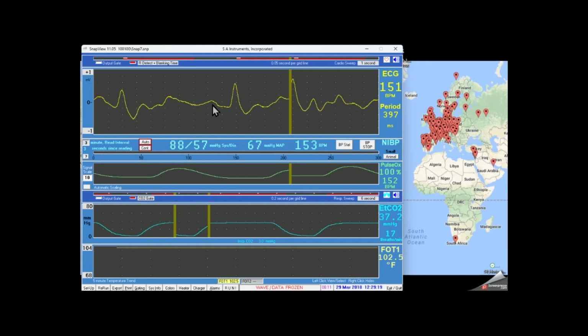As blood flows in the presence of a strong magnetic field, an electrical potential is generated that superimposes with the animal's normal electrocardiogram. This blood flow artifact occurs in the T region, and it can be quite large. It is largest with larger animals and higher magnetic fields. The artifact negates the possibility of doing ST segmentation.